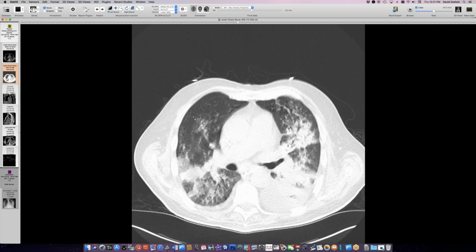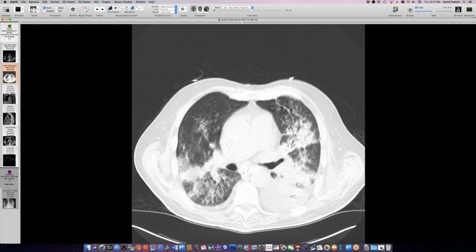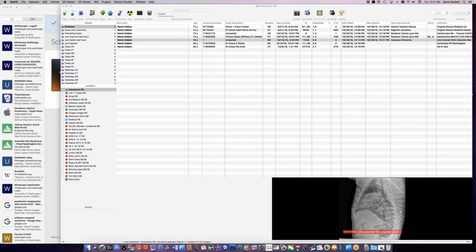They identified by the DNA that it was either Posadasii or Immitis. I think those are closely related species. And this is extensive cocci now with a micro abscess pattern and a bad pneumonia. So cocci, it's all over the place. So when somebody comes down from Alaska, you have to wonder where else have they been, because people move around so much.